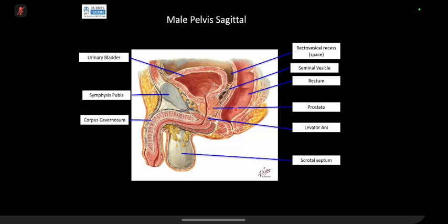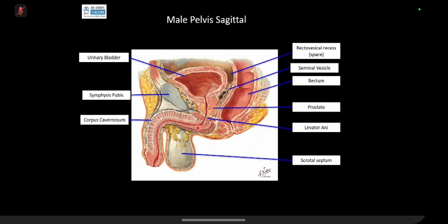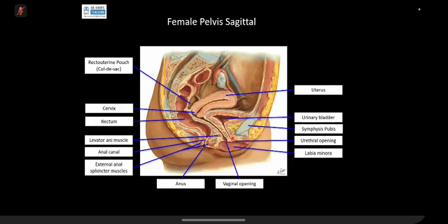Rectum, this is the rectum, this is the anal canal. Rectum is MRI world, and I'll teach you a bit of MRI. The surgeons all want more MR. It's not your territory as gastroenterologists because they stage carcinoma of the rectum. But I'll give you a brief when we come there, not in the colon session. So this is the rectum here. This is a female, and this one was a male. And then is the anal canal.